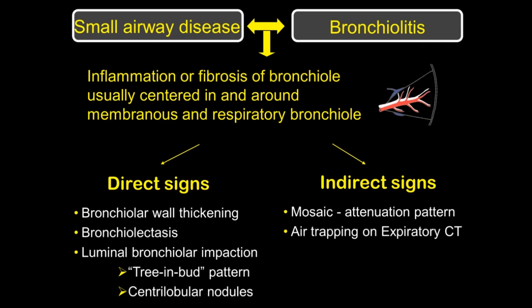Small airway disease or bronchiolitis, as a definition, includes inflammation or fibrosis of bronchioles, usually centered in and around the membranous and respiratory bronchioles. High-resolution CT may show direct and indirect signs.